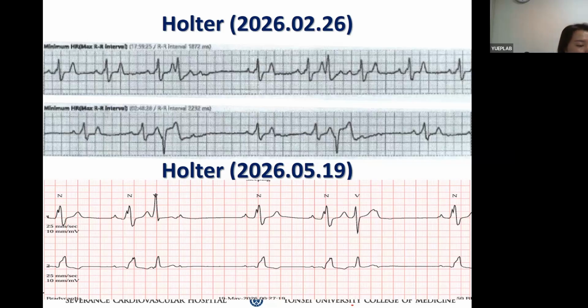You can notice that it follows a different time of a T. Can you see that? The first PVC RR interval is shorter, then the P fell later. The second PVC got longer, and then it went to the top of the T wave. And the longer one has a little bit of a different morphology, a little bit narrowish looking. It is probably a coupling-dependent aberrant conduction, I think. But I think probably same focus.